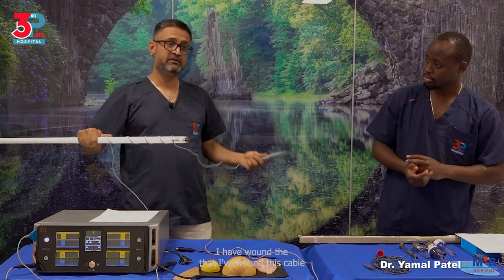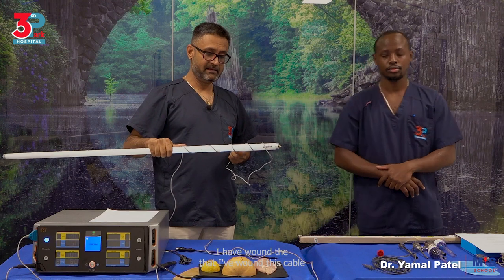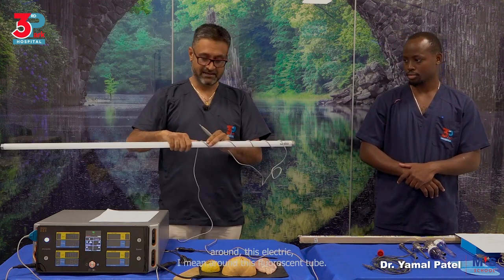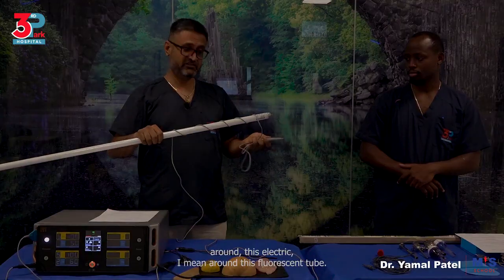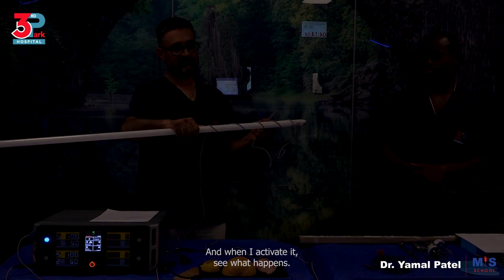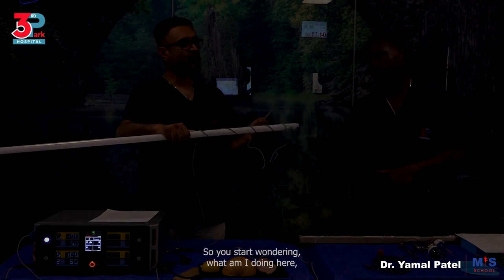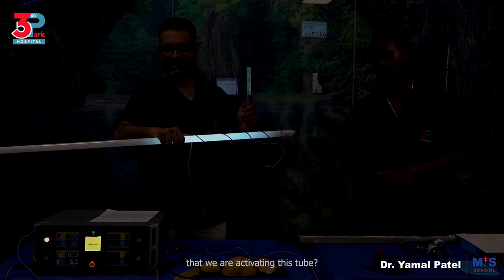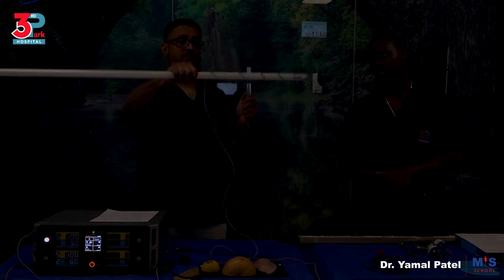I have wound this cable around this fluorescent tube. And when I activate it, see what happens. So you start wondering, what am I doing here that we are activating this tube?